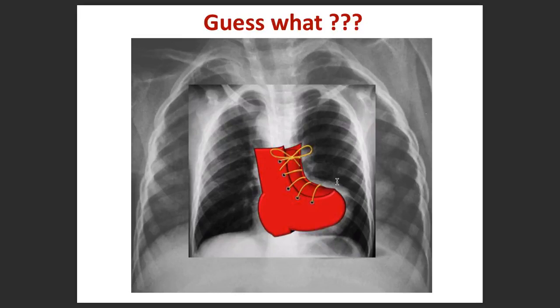What do you see? You notice this is more of an upturned cardiac apex, right? So you notice right ventricular hypertrophy. It's not always present, but in the majority of patients, up to two-thirds of patients with TOF, will be having this. The narrow upper part of the boot results from a small or absent main pulmonary artery, partly caused by a narrow infundibulum and hypoplastic main pulmonary artery. Okay.